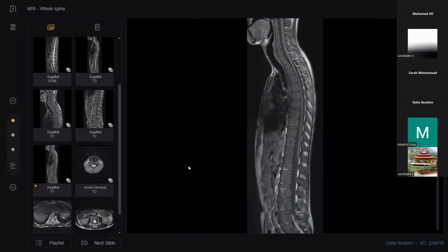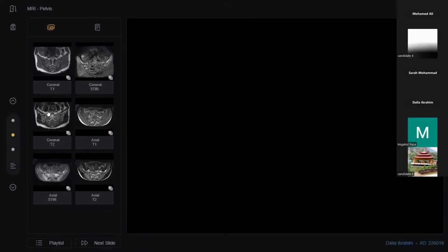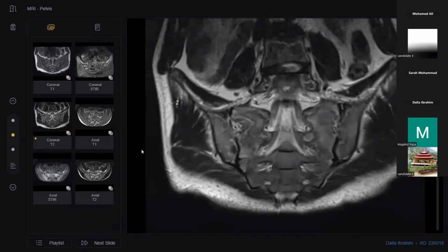So that's why Dr. Dalia said we have abnormal signal in the T1. Okay, thank you, Dr. Muhammad. Okay, this patient also had MRI of the pelvis.